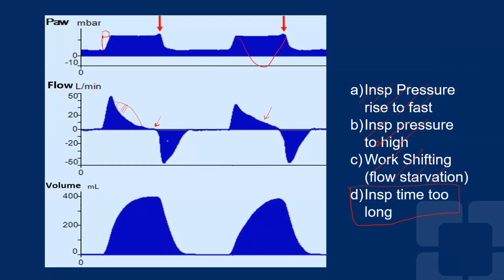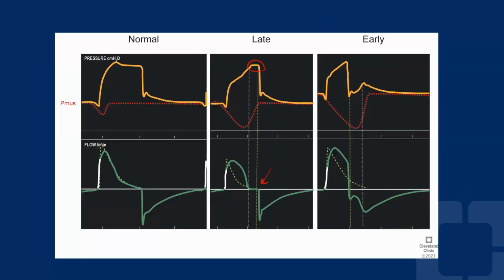If you were stepping on the inspiratory limb of the ventilator, you technically during expiration should not see abnormalities on your expiratory phase. You should see them through the inspiratory phase, besides the alarms. So this goes out. And so what you have left is stepping on the expiratory limb. So something is increasing the resistance in the circuit.